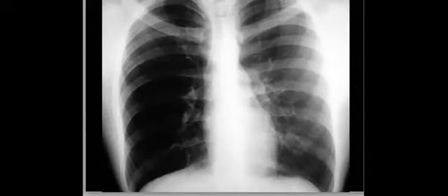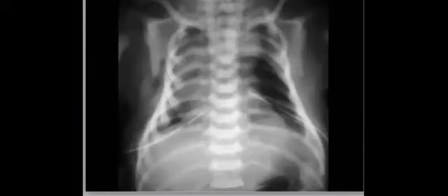Poland syndrome, if there is absent pectoralis. It can also be what we mentioned, foreign body, Macleod, perfect. Marwa, mastectomy, perfect. Macleod, Swyer-James, okay, the same. Hypoplasia, so it can also be pulmonary hypoplasia. Like this one. It is not a very nice picture, but yes, it can be hypoplasia.